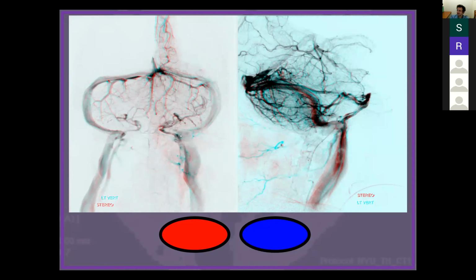So in every case, you want to see the structures. This person has a very good outline of the brainstem here. Again, mesencephalon, anterior pontomesencephalic, anterior medullary, anterior cervical, posterior cervical, precentral, right? Not a big confluent group posteriorly, but this person has a big petrosal group.